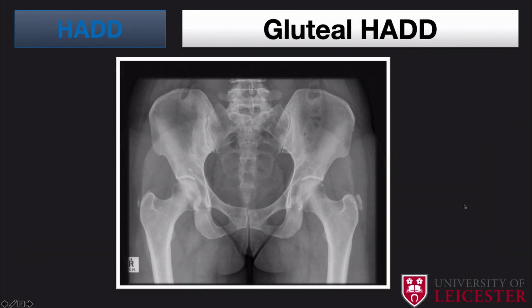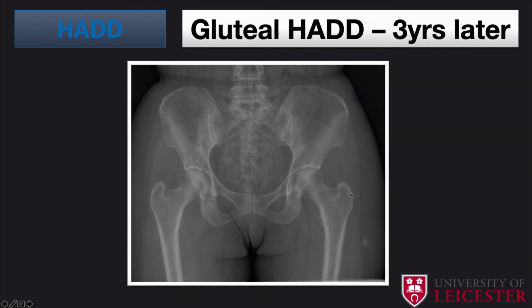What about lower down in the pelvis? And you look at the pelvis, all the joints look quite preserved. The patient has still got quite a lot of hip pain bilaterally, and you can see over these structures, this is your greater trochanter, and this is classically where the gluteal muscles insert. You have this amorphous oval shaped focus of calcification, not only on the left side, but also on the right side. And there's not much osteoarthritis, and there's no bone lesion, and therefore findings here are likely keeping with hydroxyapatite deposition disease within the gluteal tendon attachment.